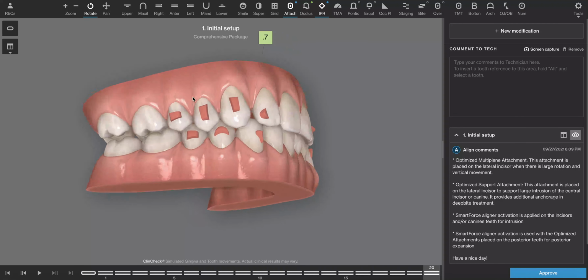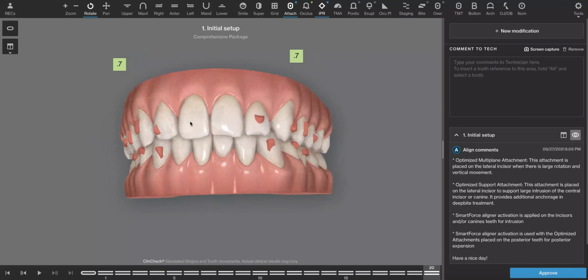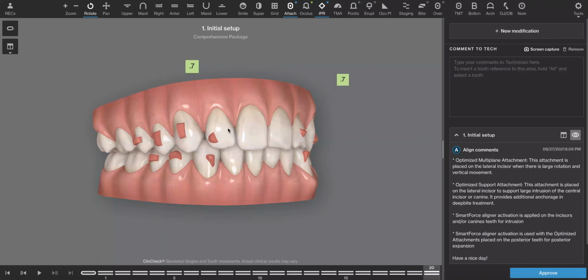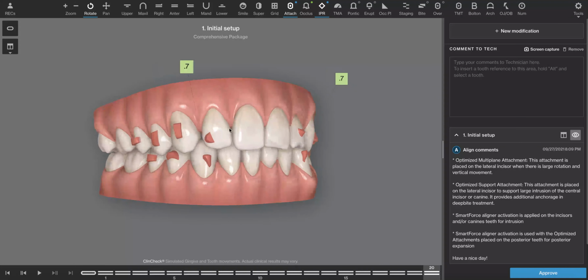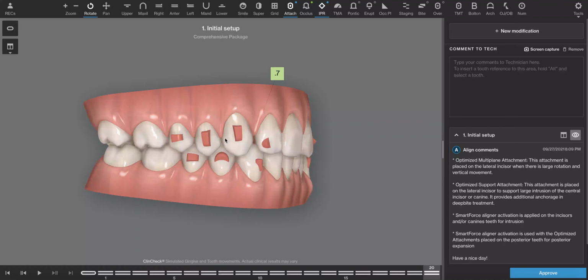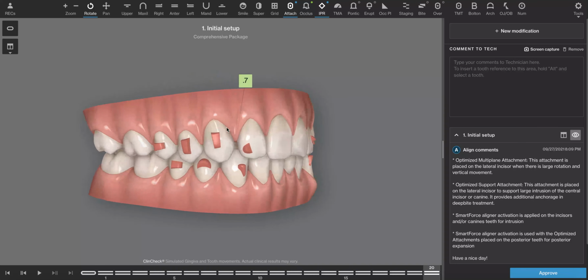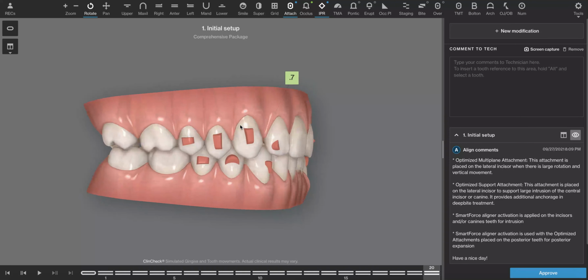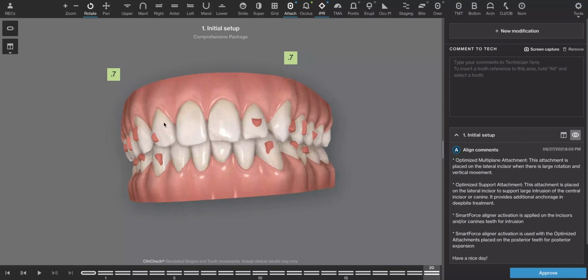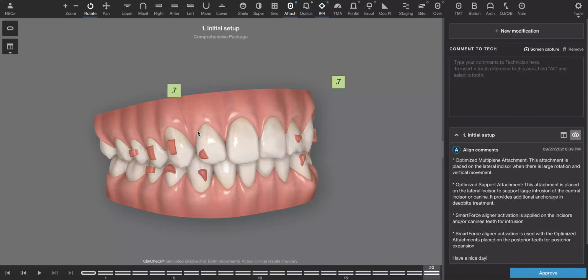When you do that, this space might get a little bit bigger, so I would tell the lab technician to add the additional arch length that is created as those teeth are proclined to the distal of the canine and between the upper 1 and 2. So essentially there would be equal spacing between the upper 1 and 2, upper 2 and 3, and upper 3 to 4. That will help spread out the restorative space needed to help solve this Bolton discrepancy.